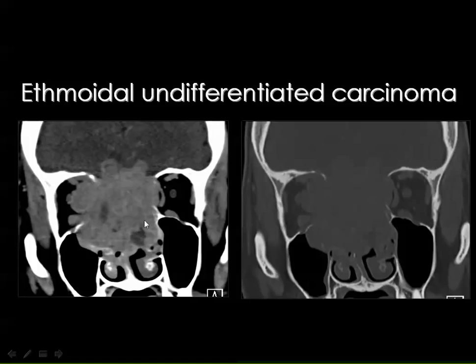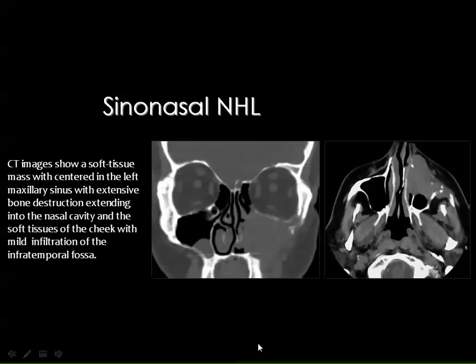with aggressive destruction of the medial orbital wall on both sides, intraorbital extension, destruction of the anterior cranial fossa roof, floor, and intracranial extension, destruction of the nasal fossa, and the extension infiltrating the turbinates and the bony nasal septum. Then you can feel the aggressiveness of the mass in order to separate benign from malignant lesions.